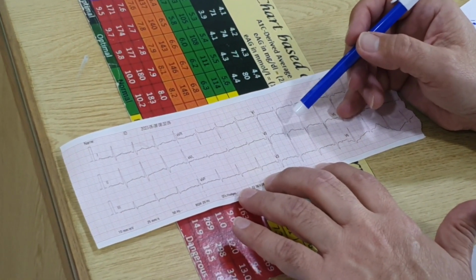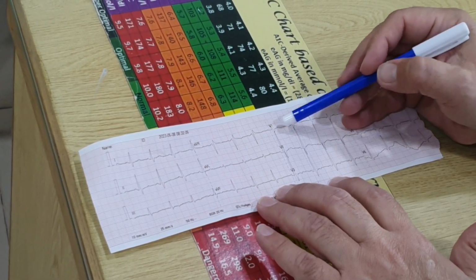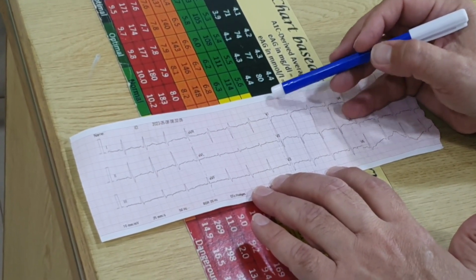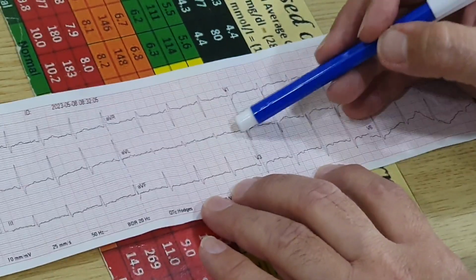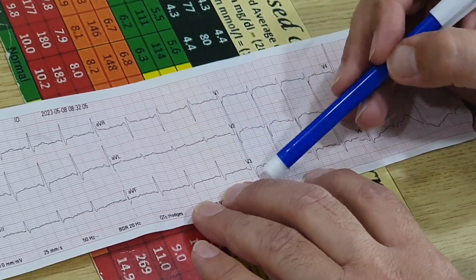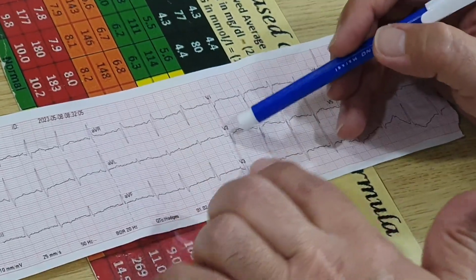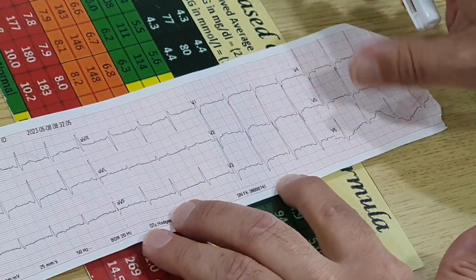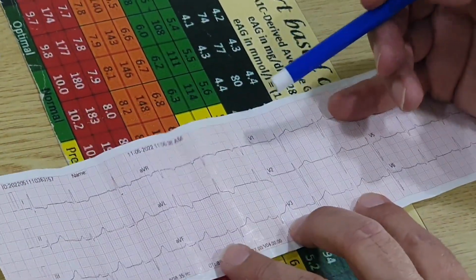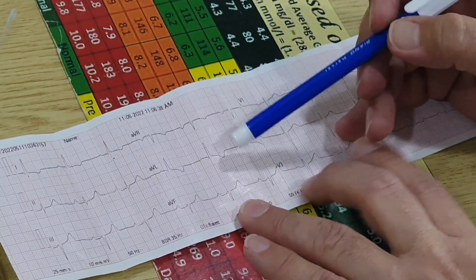But likewise, let's see if there is any right ventricular hypertrophy. So we'll see leads V1 and V2, and we'll see the height of the R waves. We don't see any tall R waves in V1, but we see very tall R waves in V2 and V3. Tall R waves in V2 and V3 are not synonymous with right ventricular hypertrophy because you need right axis deviation as well. There is perhaps an element of right ventricular hypertrophy in this one, but it doesn't fit the criteria.